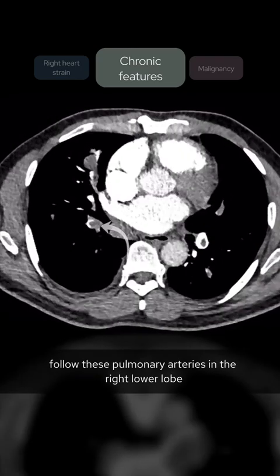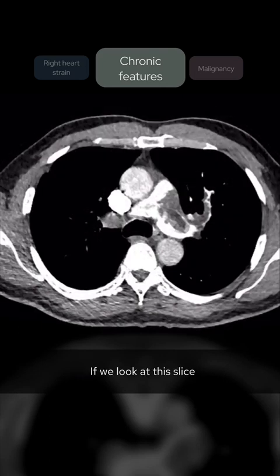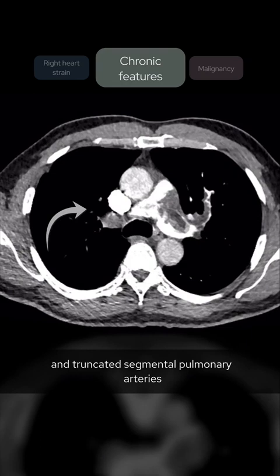In our case, follow these pulmonary arteries in the right lower lobe, and you'll see some are occluded. If we look at this slice, we will see compared to the left we have reduced vessel caliber and truncated segmental pulmonary arteries on the right, so we certainly think about chronic pulmonary thromboembolism in this case.